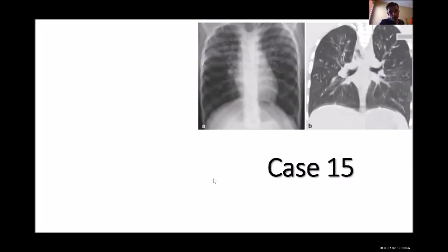Okay, Osman, Muna, you guys are just jumping, okay? You'll become dangerous in the exam. Osman, Isa, and Muna, so don't give diagnosis. Don't say bronchiolitis. It's very hard to know it's bronchiolitis. I would say dilated small airways. Just always be a politician. Be a liar. Why are politicians good? Because they lie. So remember, you don't need to say the truth. You don't need to tell the examiner that you know. Just tell the examiner in a way that will never make you wrong. So don't jump, okay? Always use smooth words, okay?